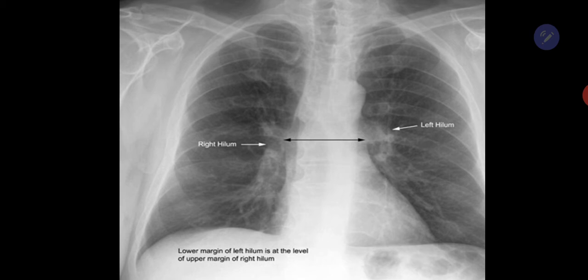Now, let us see. In this image, we are shown the hilum. This is the right hilum, and this is the left hilum.